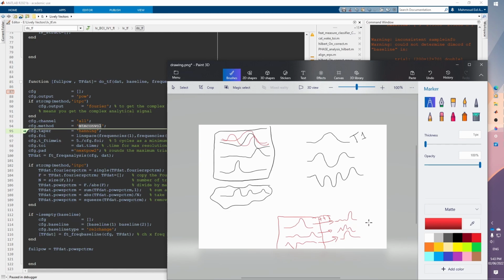So we can look at the spectrum, and we can see the effect that we will get in frequency. And this is good because right now we can see the effect that we have for each of these tapered signals, and then we can sum all of these and get one frequency spectrum.